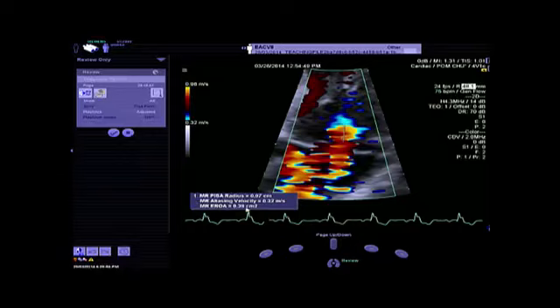And you know that the cutoff is 40. Below 40, between 20 and 40, is considered as moderate. But in primary mitral regurgitation, we can use two different cutoffs in the moderate part, the mild to moderate and the moderate to severe. And in these patients, we have moderate to severe mitral regurgitation.